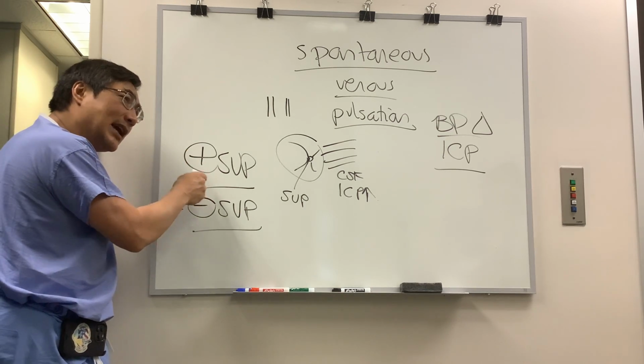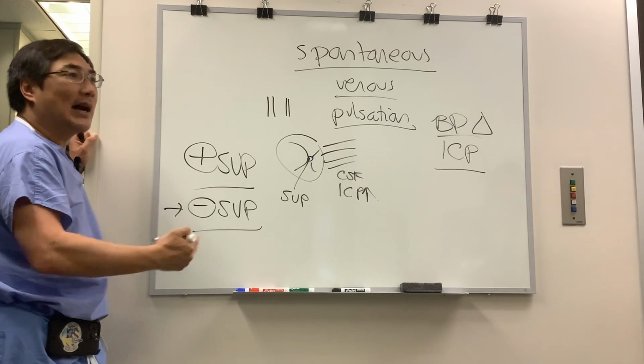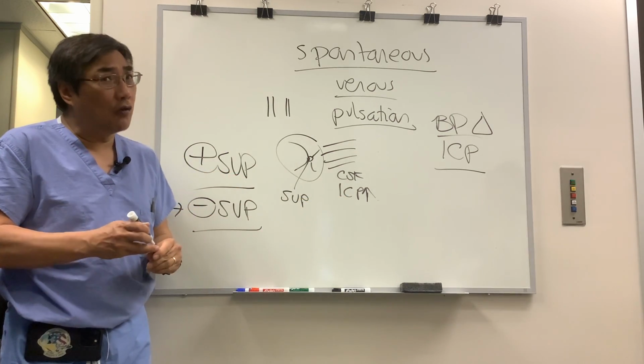However, if we see SVP, it is a reassuring sign that whatever you're seeing in the disc might not be papilledema and might not be increased intracranial pressure. I would never use the SVP by itself to make a determination of something that can only be measured.